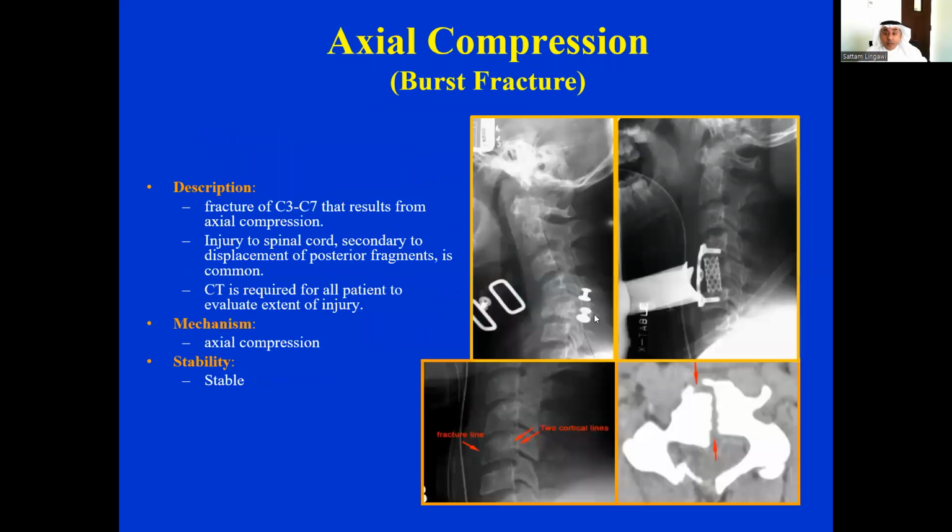When it occurs in the rest of the vertebrae, it results in a compression fracture: fragmentation, loss of the vertical height, increased density, loss of alignment, the gibbous deformity, loss of the integrity of the intervertebral discs above and below, and widening of the interspinal spaces. This is associated with retropulsion of bone fragments into the spinal canal, formation of a hematoma, and cord compression.